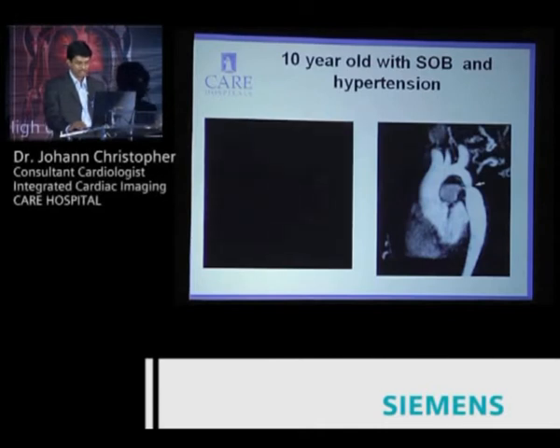Thankfully, these videos are playing, and this is an example of a coarctation of aorta, and you can see the right-hand picture. This is the MR contrast image showing a severe discrete coarctation. What is also important is we note the significant collaterals which are there, and also the shelf extending from the distal left subclavian artery right down to the coarc, because once you have a significant shelf, these infants are actually well suited for an intervention. They're well suited for a stenting, endovascular stenting, rather than surgery.